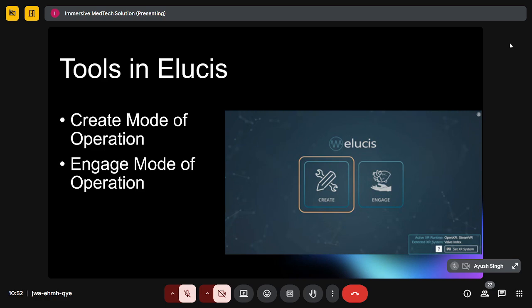Basically it's a 3D mode of paint. So we can design any sort of shape directly with a single clicking operation. That will further show how we can use that for any cranial implants. For example, if we are designing a cranial plate and we don't have much time and we require high sets of efficiency.